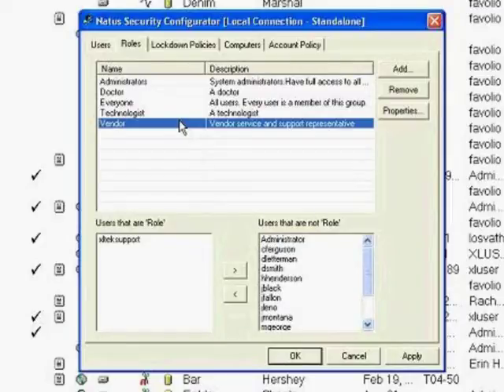So again, rather than creating individual profiles for each of the 50 users that we have, we're going to create a profile for each group. And then let's just put the users into groups. So rather than creating the profile 50 times, if we decide to utilize, let's say, these 5 groups, we only have to create the profile for 5 groups. So let's look at these profiles then.